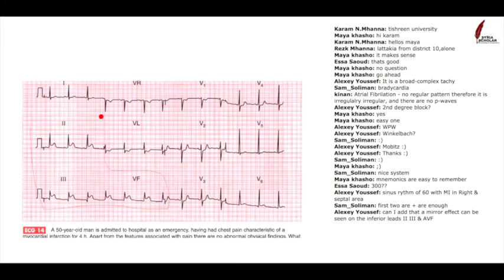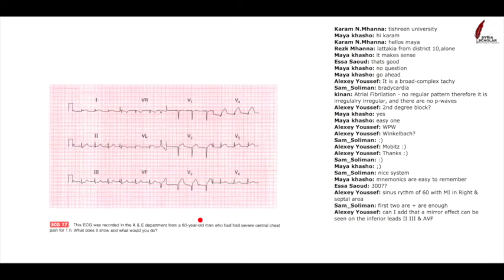So this person is having chest pain and ST segment elevation in the inferior leads, so he is having an acute inferior myocardial infarct. So good, you've made all the diagnoses.